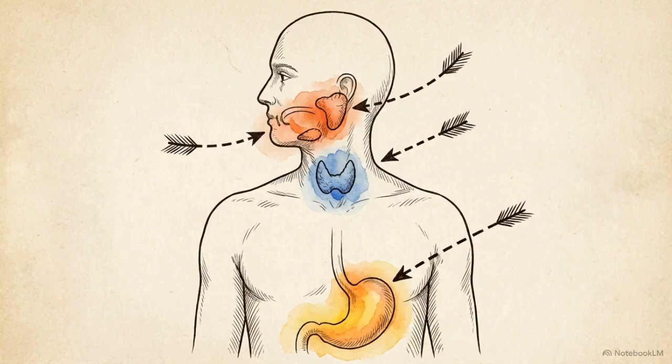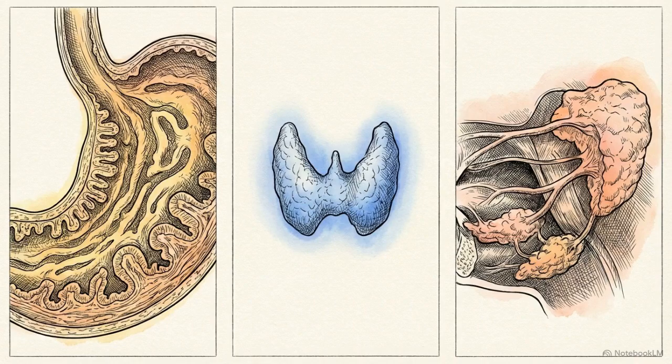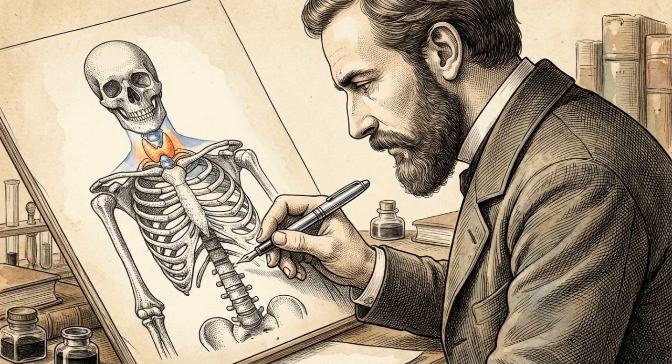Instead, it produces a specific diagnostic signature on the clinical scan. The errant tracer localizes in the stomach, the thyroid, and the salivary glands. Recognizing this error prevents a diagnostician from misidentifying benign gastric or glandular uptake as metastatic disease.